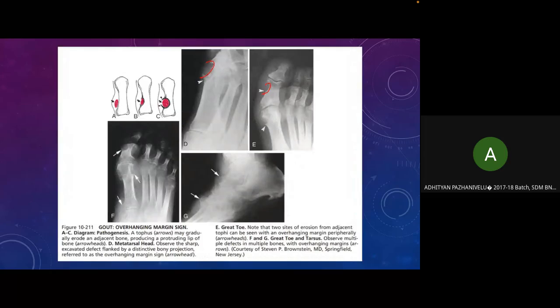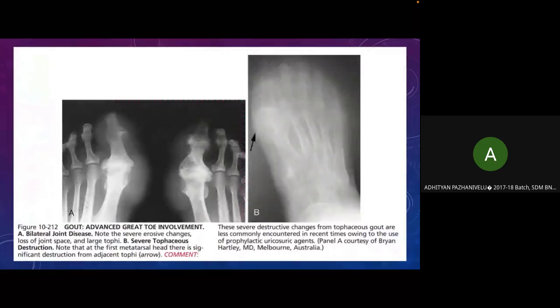Okay, that is commonly seen, and it looks like a dirty joint, and you know that there is some arthritis, and then you have to work it out biochemically for uric acid level, rheumatoid arthritis, or something which you're suspecting. These are all one. And one small table on arthritis.